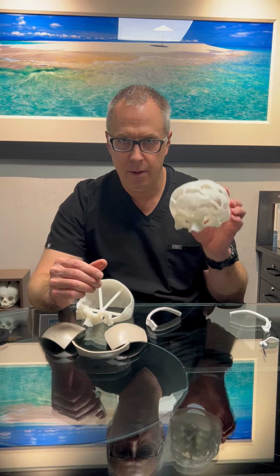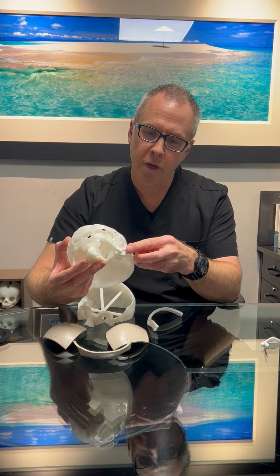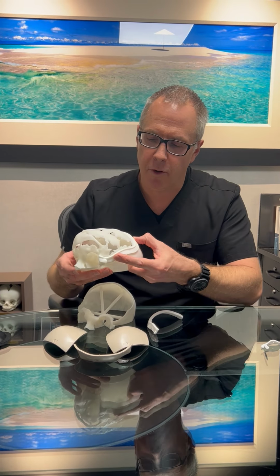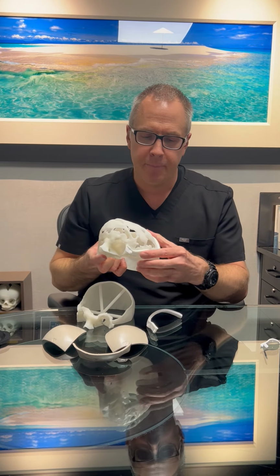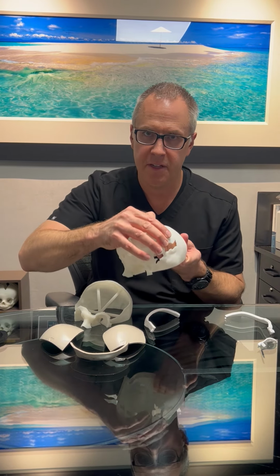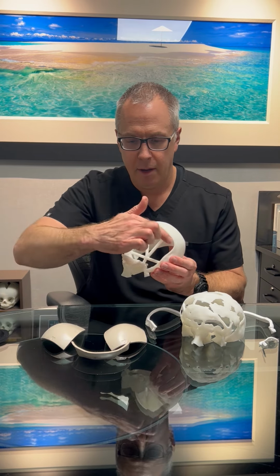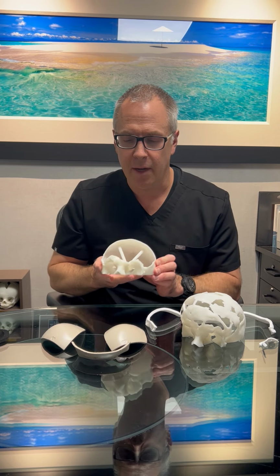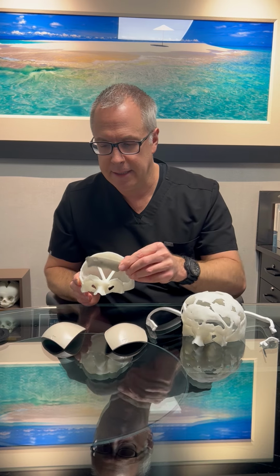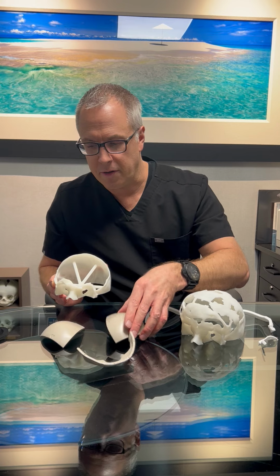So the company just provided me with a model of the existing skull, in addition to bone cutting guides, which we will use in the operating room in order to mark and then properly cut out the abnormal skull. So we're going to remove all of this skull right here. Then we're going to be left with a very large skull defect, and we're going to reconstruct it using several PEEK implants. So the pieces will fit together, reconstructing the skull.